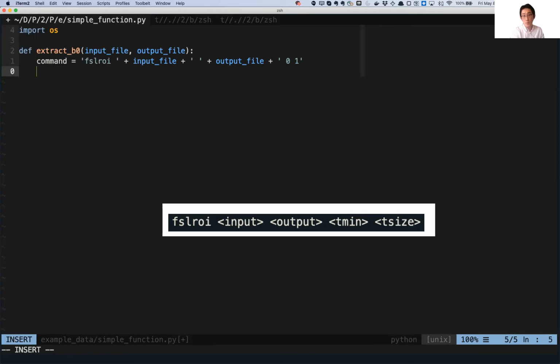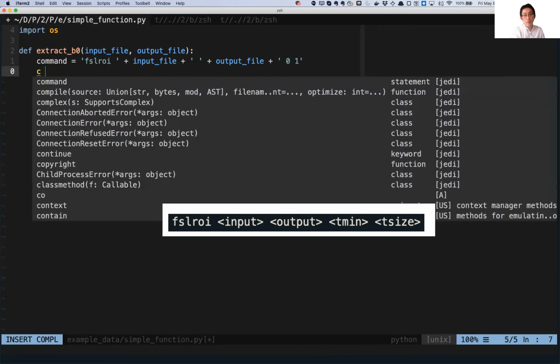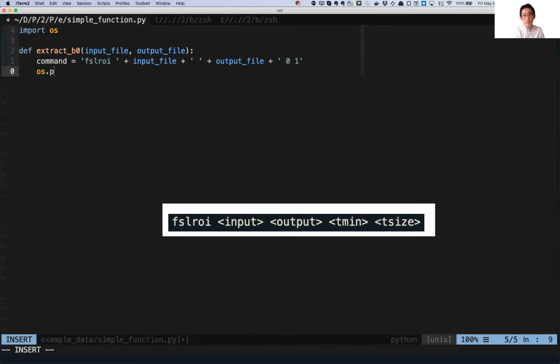All right, you just made a command. So command here, you can run the command as os.popen(command).read(). You will run it. And then, well, you can set out like this and print out. It will not output anything on the screen, but I'm just getting the output. Well, let's not do this. You can just do this. All right, and save it by :w for those who don't remember how to save it.